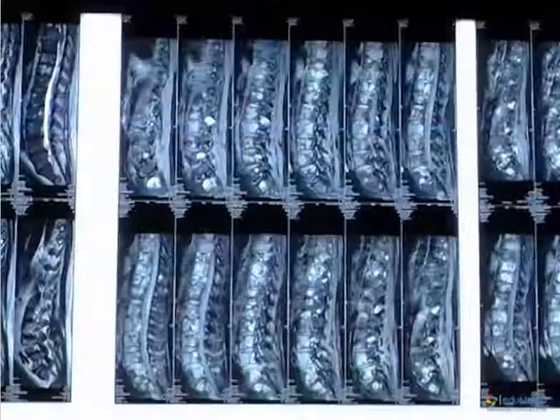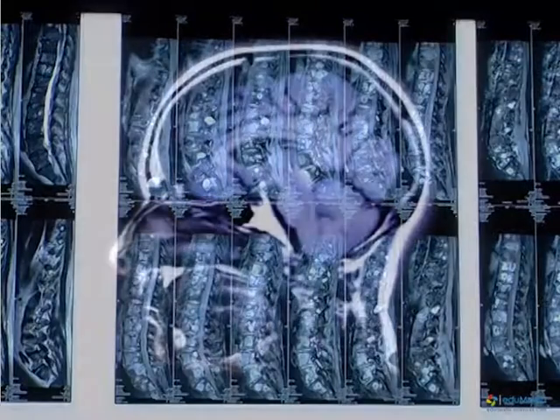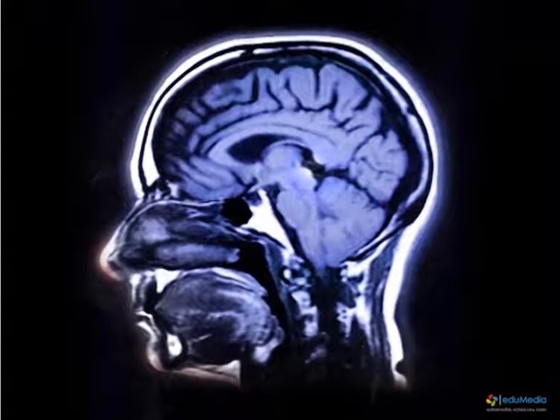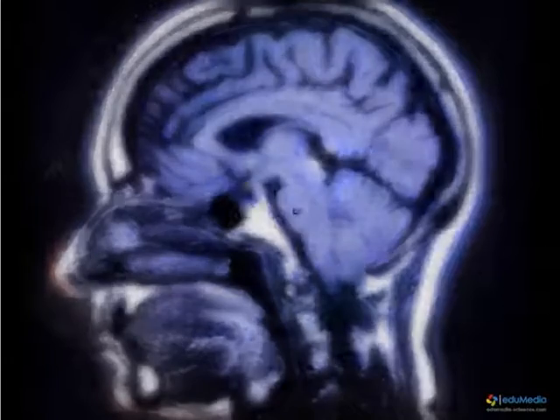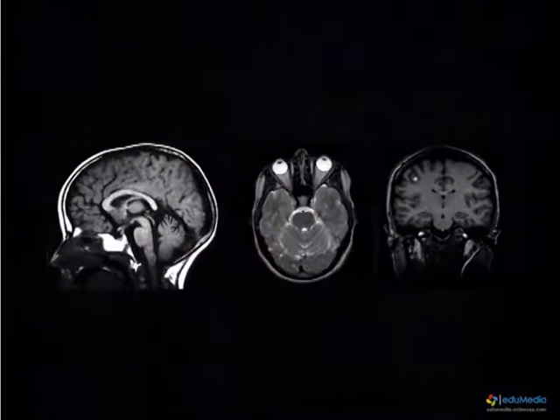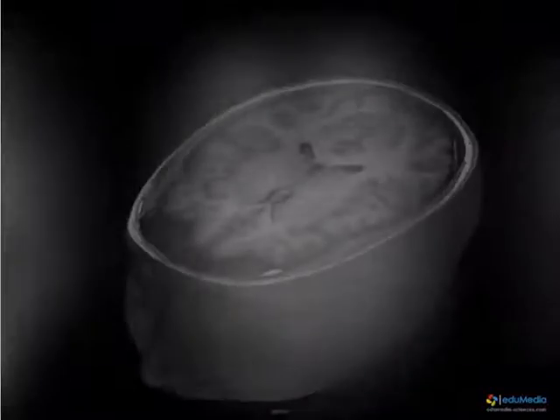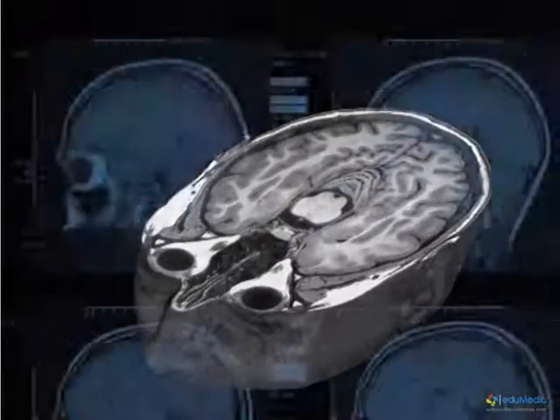By carrying out several sequences, almost all of the tissues can be explored, on the condition that they contain water. MRI is thus not used in the examination of bone. In this photograph from a cerebral MRI, the images that have been obtained have excellent resolution for contrasts. It is possible to produce sections in all spatial planes. Computer processing, as with the CT scan, makes it possible to reconstruct a three-dimensional image.